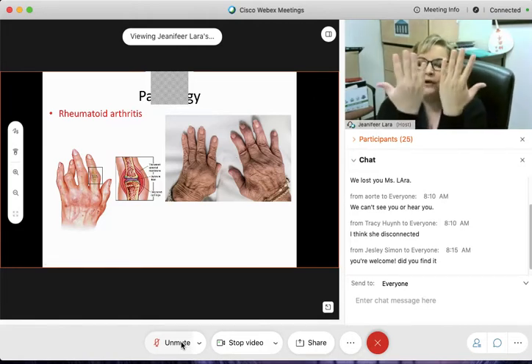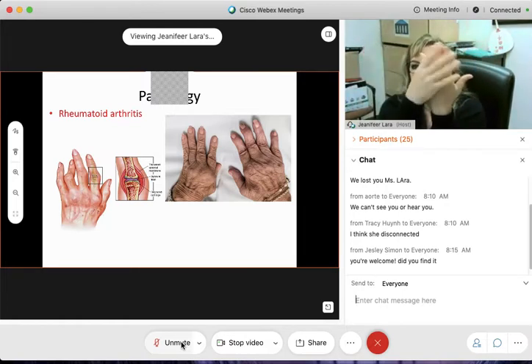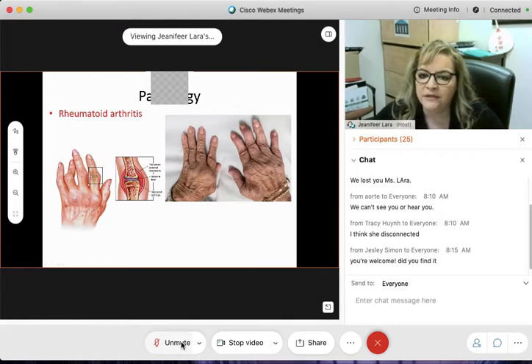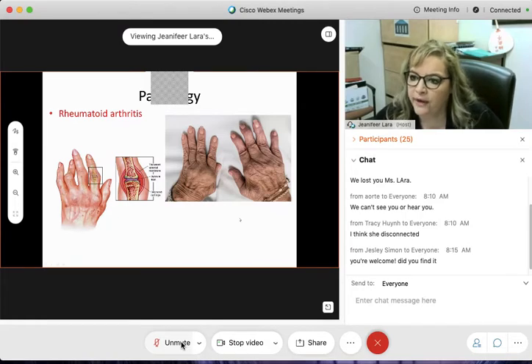You can have your hand straight out like this, your wrist can be straight, but the fingers are going to swan towards the pinkies. So you can see here the patient is trying to be in a PA, and the digits are going to start swanning to the medial side. And that is a classic sign of progressed rheumatoid arthritis.